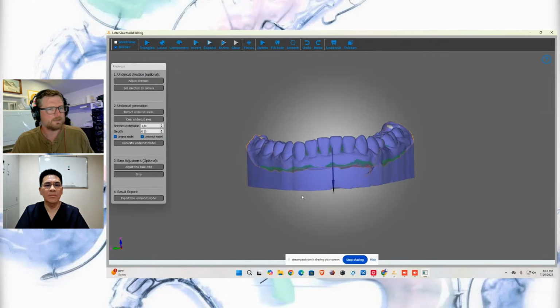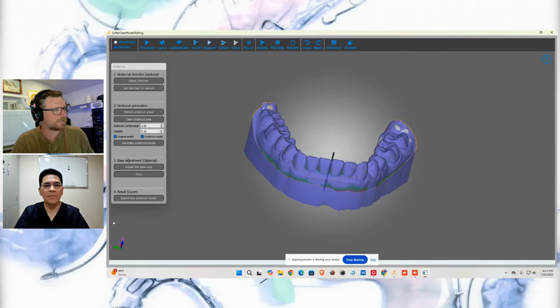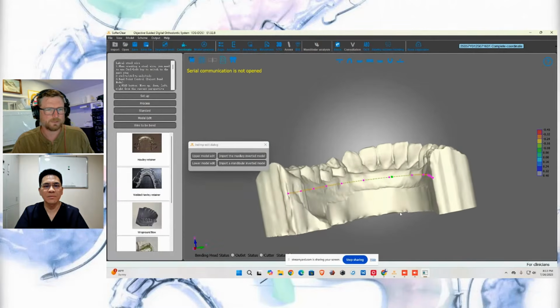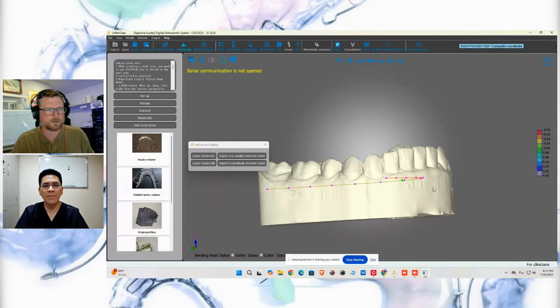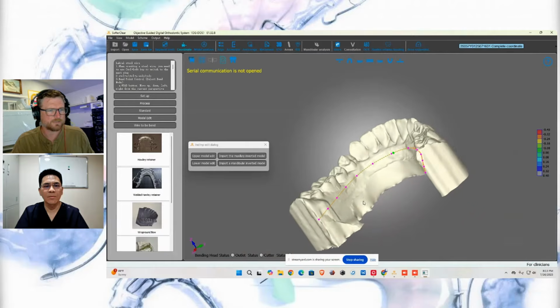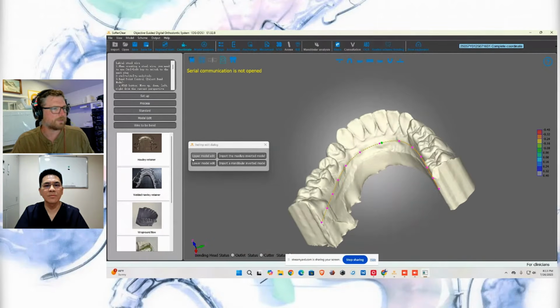So we're ready to go to the next, right? Yes. Export. Okay. Then you can close this, and I'm back to here, and then that changes to the closed model. And you can see here where the undercuts were. So over here where there's a big undercut, it's filled in now. And over here also. So now we'll do the upper.